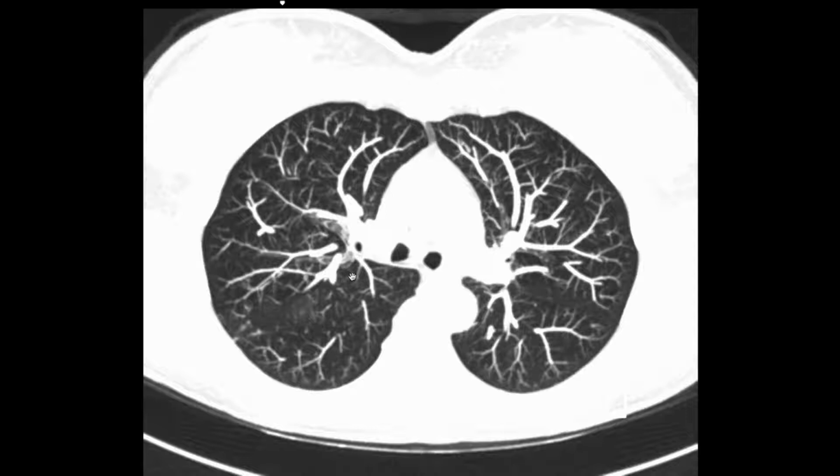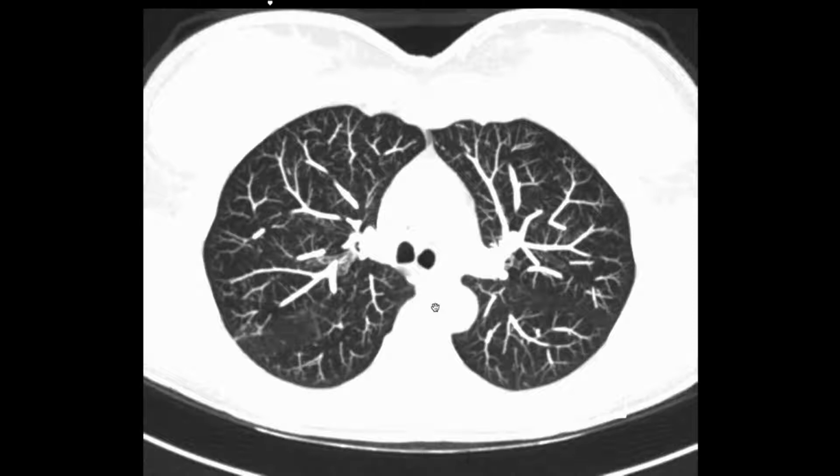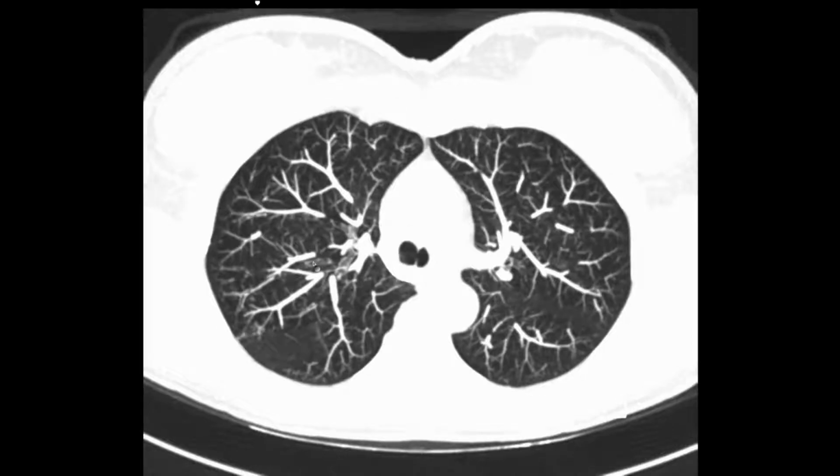Those are relatively easy, but it's the ones in the periphery, the small guys, especially when they're by themselves, that are kind of irritating. Like here, you're talking about they line up in a bronchus like that. Sort of. Yeah, you get a nice little row of ants.